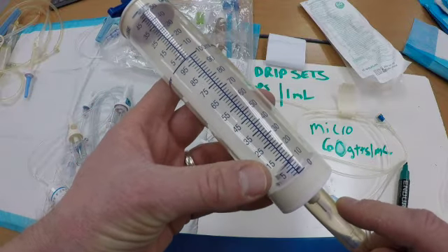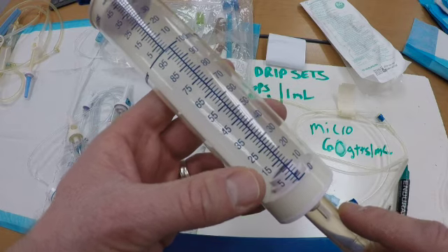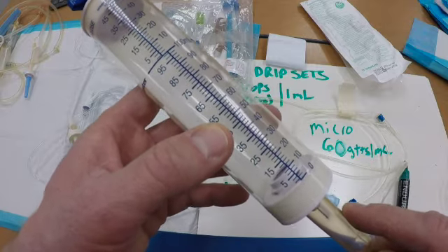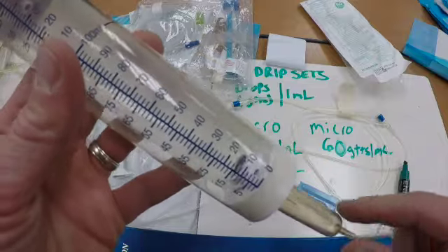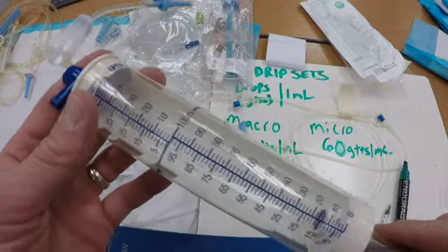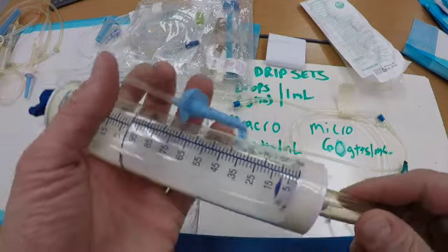So you have a child and you want to give a fixed amount of fluid bolus. And we decided we wanted to get 50 milliliters, and we don't want to give them too much volume. So we would fill this chamber, clamp this one, and then open it up, and then we know that fluid is going to go in, and then we can reassess if we want more. We can just more carefully track how much volume we're giving a patient using the Buretrol.